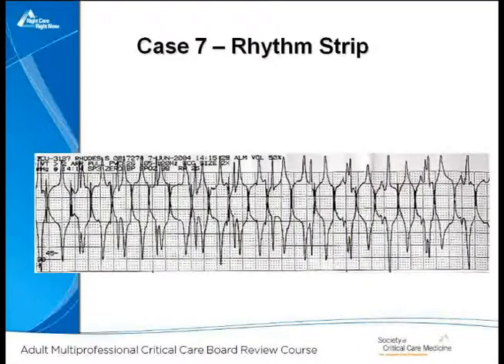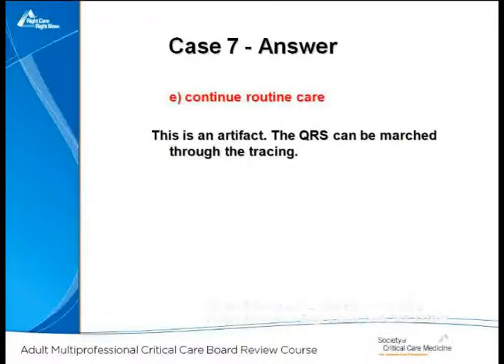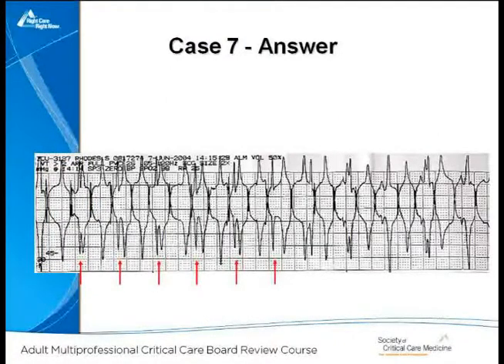Excellent. So most of you recognize that this is an artifact. And so you continue routine care. And how do you know that? Well, what you have to do is you have to see that there's something that's marching through the tracing that isn't related to these other things. And in fact, you can see that.